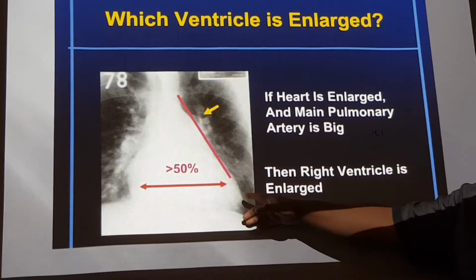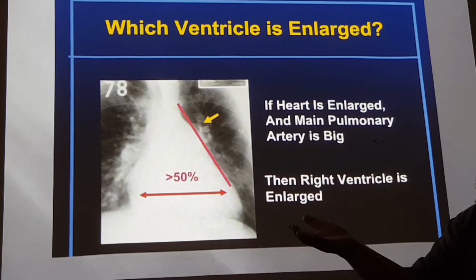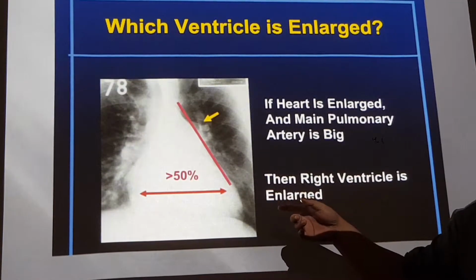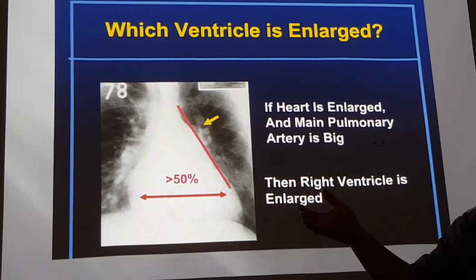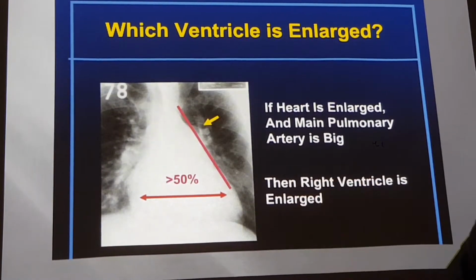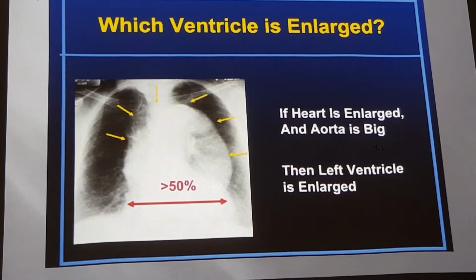In right ventricular enlargement, there's rounding of the cardiac apex and upliftment of the cardiac apex, as differentiated from left ventricular enlargement. In right ventricular enlargement, the cardiac apex is rounded and uplifted. This is what they call the boot-shaped heart. But that's not specific. So next slide.